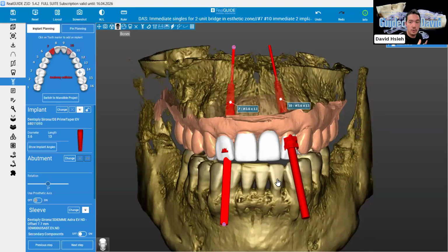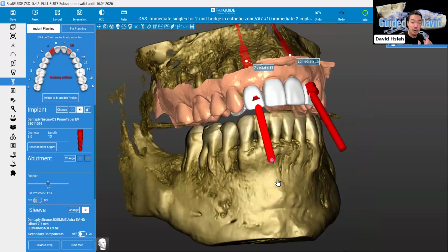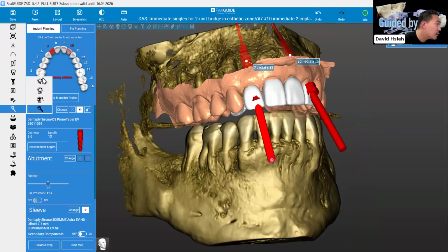So when I do a single tooth here, I usually like to see how the bone looks and how the root looks, right? So that will introduce another two AI tools right here. We kind of gotta jump around, not too much, it's just here, right? So stay with me. Here to this tool that's called segmentation. Let's just hit that. So you can see there are 4 functions to select from.